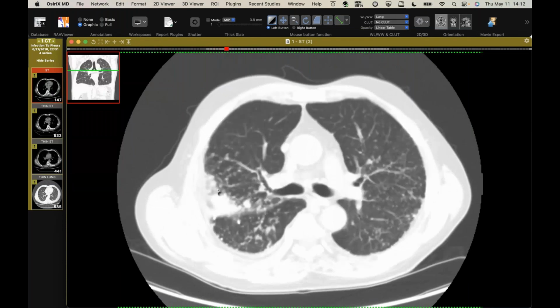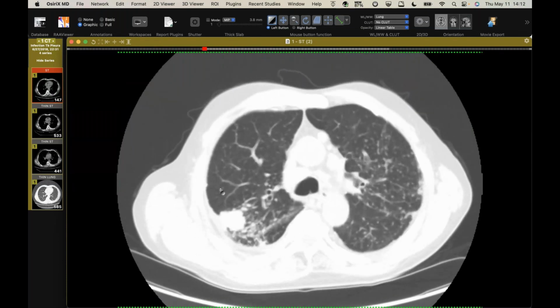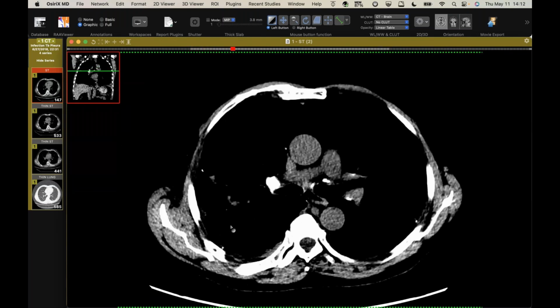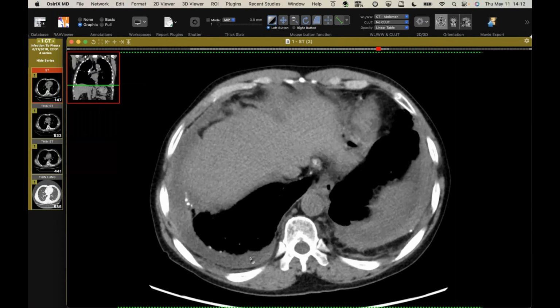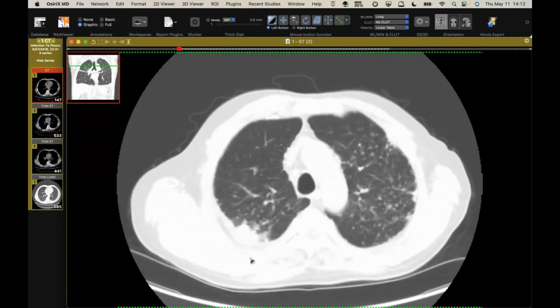And I think at the outside hospital, this was concerning for a mass or something, but we just told them if you look at it, it's actually got a lot of calcium in it. So that's just all part of the sarcoid. But what's interesting is they sampled this pleural fluid and actually identified tuberculosis. It was lymphocytic, and I believe there was sputum positivity, but it was pretty weak because there was nothing in the lungs, even going back and looking, that suggested this patient had pulmonary tuberculosis.